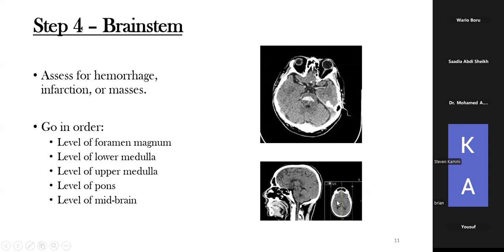mid-sagittal, but if you see this same scan over here, I hope you can see my pointer. This is your sylvian fissure. The sylvian fissure is going to separate your temporal lobe from your parietal lobe. So that's how you get the difference between the two. I hope I've answered you. If I've not answered, please just feel free to unmute yourself and ask. I don't mind.